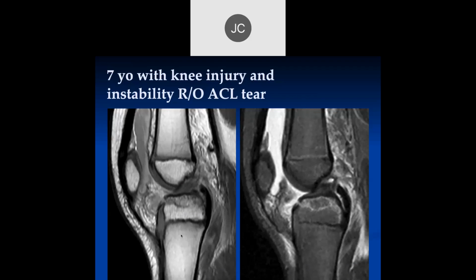So we have a young patient. I see. Yeah, I'm not seeing clear fibers of the ACL. Maybe there's a tear at the proximal attachment. Well, yeah, we're not seeing this real well here.